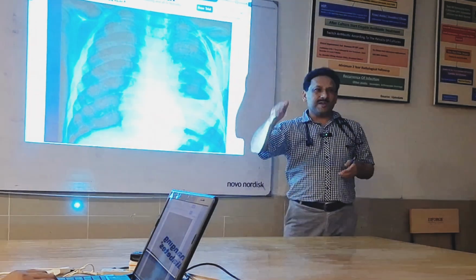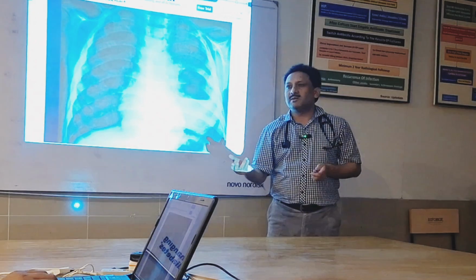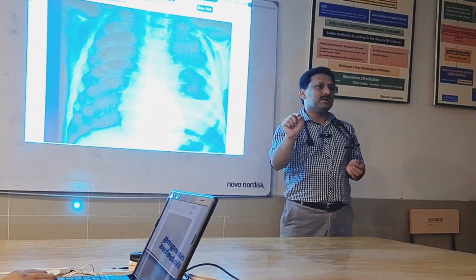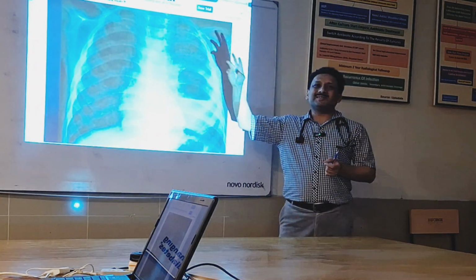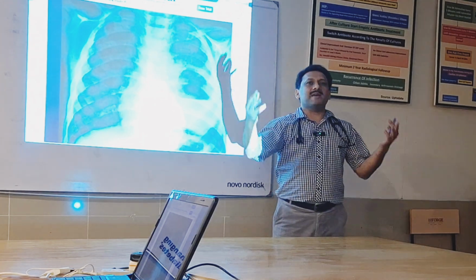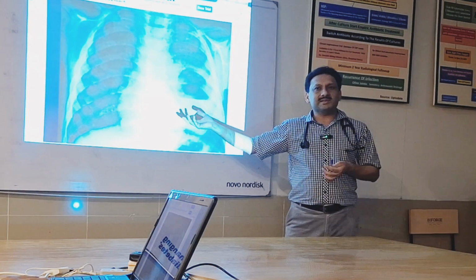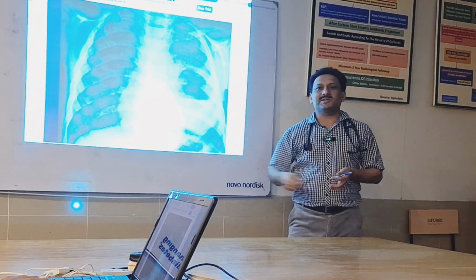If something is 1 or 2 mm thin, what do you call it? Bulla. You call it bulla when it is hairline. You call it a cavity when it is thick. A cavity having nothing inside, you call a simple cavity. A cavity filled with pus or fluid, you label it as lung abscess. A cavity can have a few other things inside, as we'll see in the next X-rays. Move ahead.